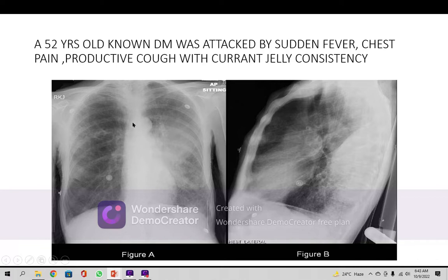Now this is the X-ray which was done, a frontal projection. The patient's details are written here, and all parameters can be interpreted here. This is the trachea, which is going on here, and look at the first intercostal space and apices, and compare the lung fields intercostal space-wise.